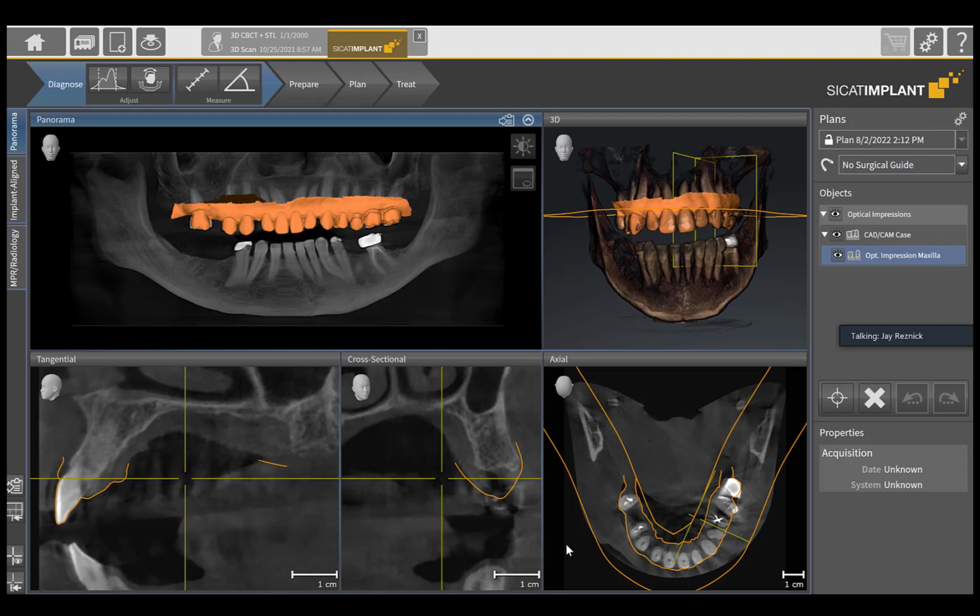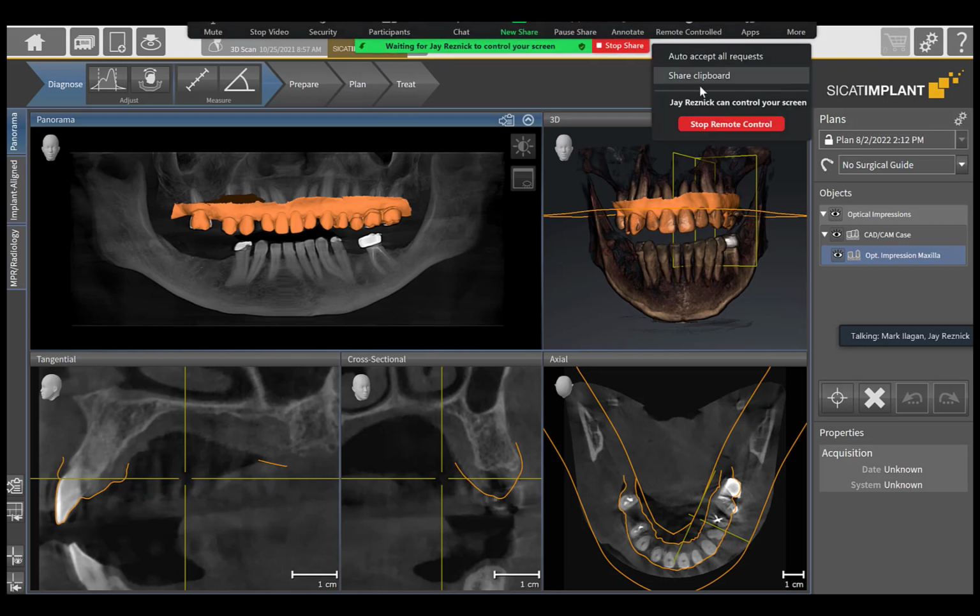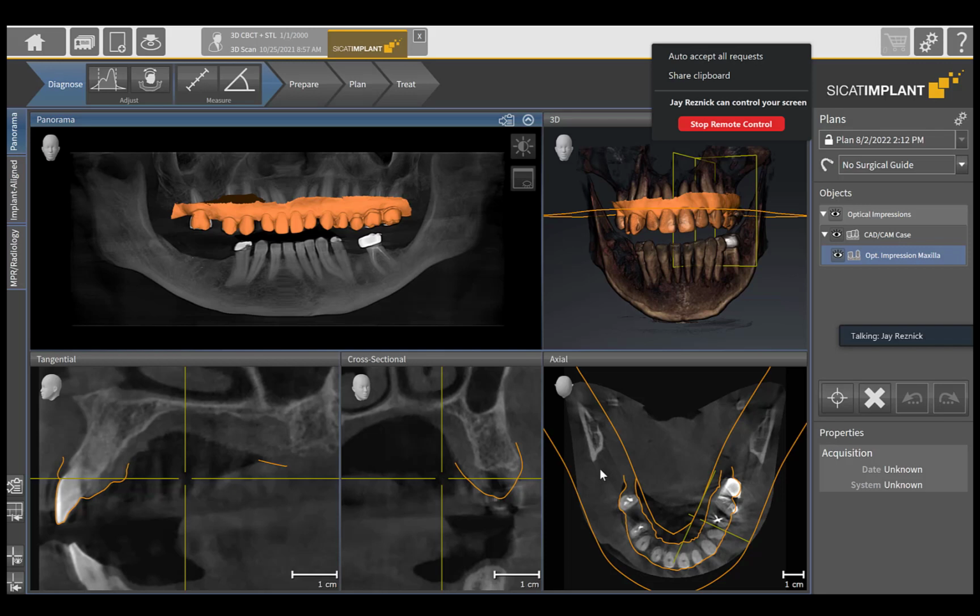But you want to have as good an idea as you can of the size, the dimensions and the location of that final crown, because you want to be able to place the implant so that it is centered under that restoration, and the emergence profile of the screw access hole is going to be in the center of your restoration, so that restoration is made easier. You don't want it to be off to one side, more lingual, more buccal. You want to try to be as centered as possible to facilitate construction of the prosthesis.